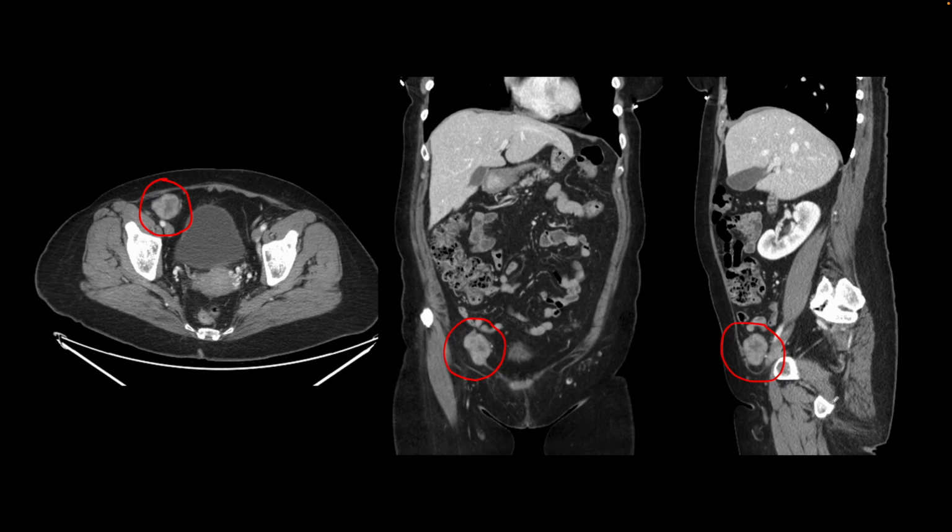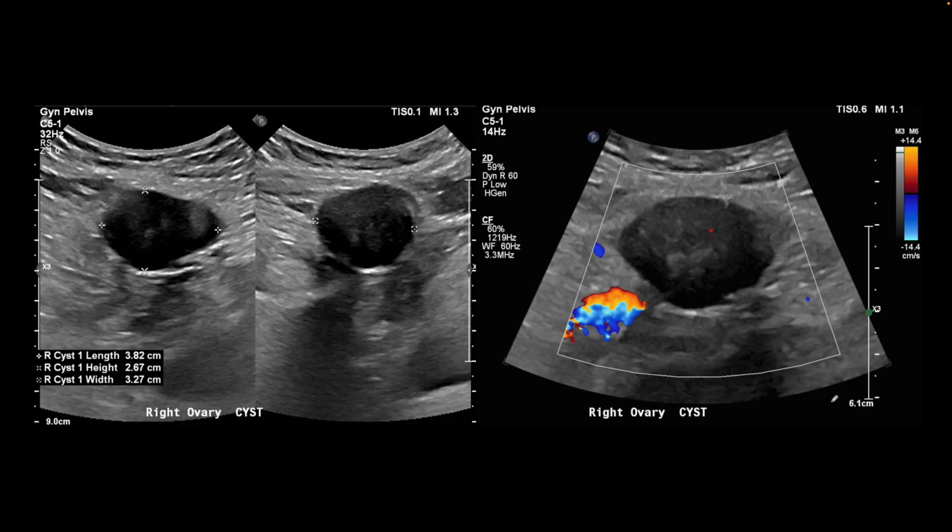And so this patient underwent an ultrasound where the technologist thought that this was the right ovary. Since they've labeled it as ovary, the mass measured about 4 by 2.6 by 3.3 cm, and it's a solid mass with internal vascularity, so that didn't answer the question. This wasn't the patient's right ovary. It's an enhancing mass pretty far from where the ovaries are.